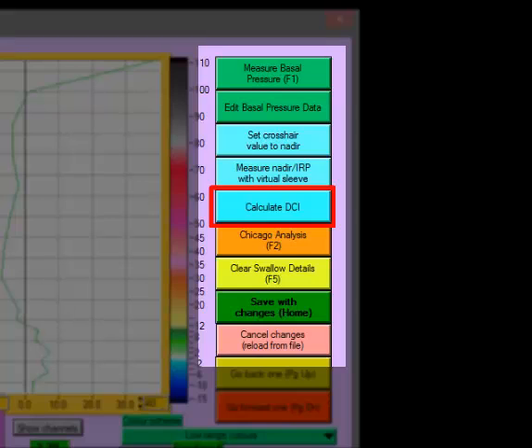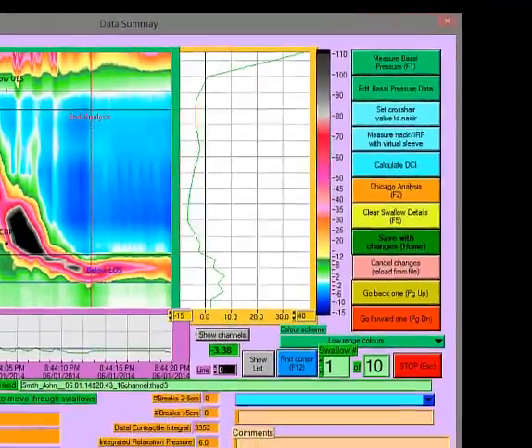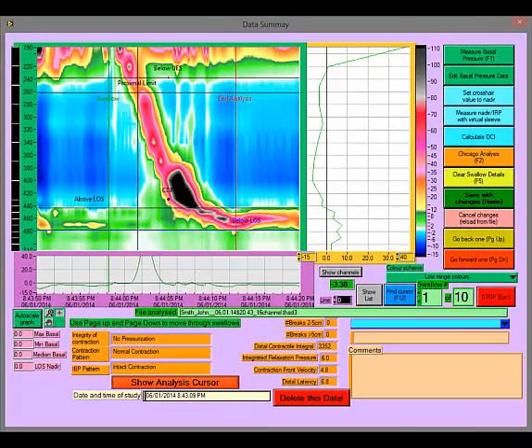If you have performed a Chicago analysis on the swallow, you can reanalyze the swallow. You can convert a non-Chicago swallow to a Chicago swallow by clicking on the Chicago Analysis button. You should ensure that if you do this for one, you do it for all swallows, as if Trace detects any swallows with Chicago data in the reporting screen, it assumes that the entire analysis has been performed according to those criteria.